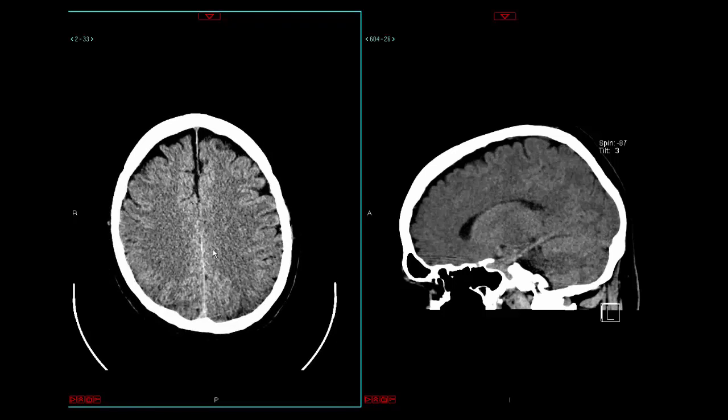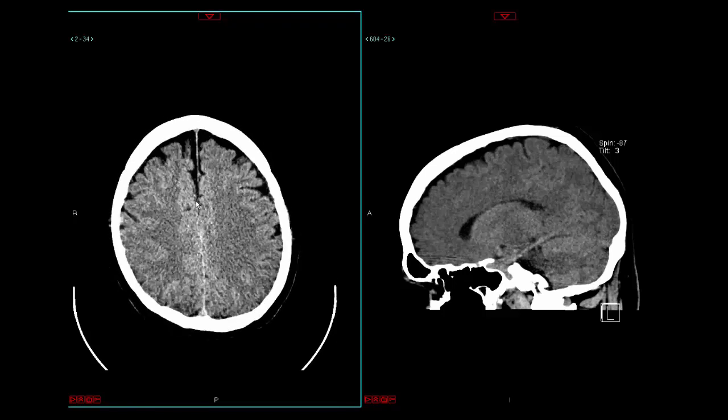Now if I go just a little bit more superiorly, we're probably in the region of the cingulate gyrus. The only point I really want to make here is that at the level of the cingulate gyrus, you may be able to appreciate the difference between the superior frontal gyrus and probably this structure being the middle frontal gyrus there. Again, that's going to be at the level of the cingulate gyrus, which is probably just above the body of the corpus callosum.